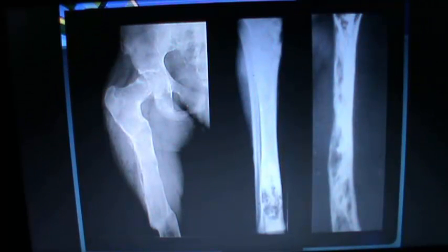On the left, we can see that the bone lost its waist, the cortex is thinned, there is ground glass appearance that denotes homogeneous dystrophic calcification of the fibrous tissue. Weak bone result in fractures which heal with unhealthy pattern, either with deformity or with pseudoarthrosis.